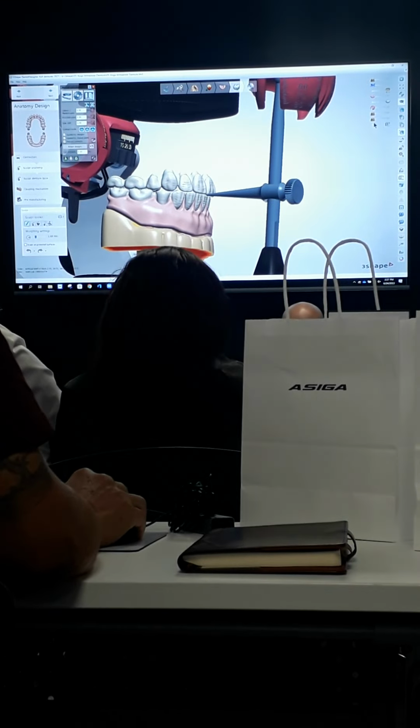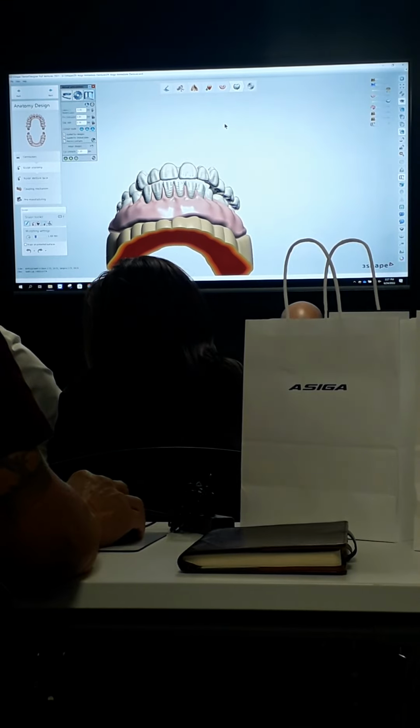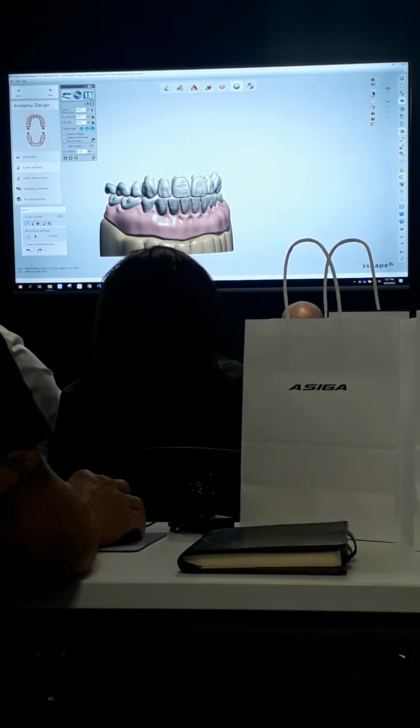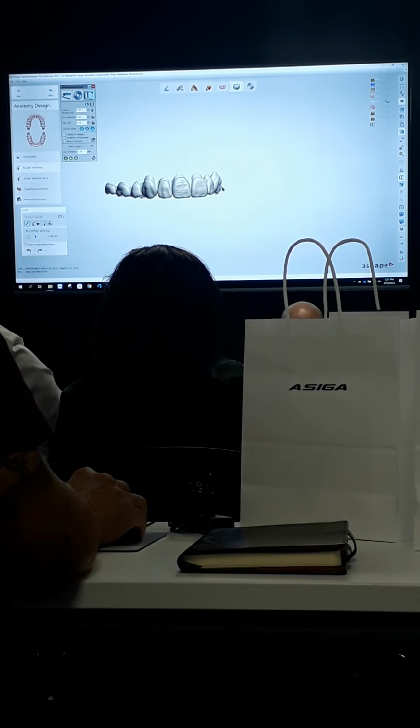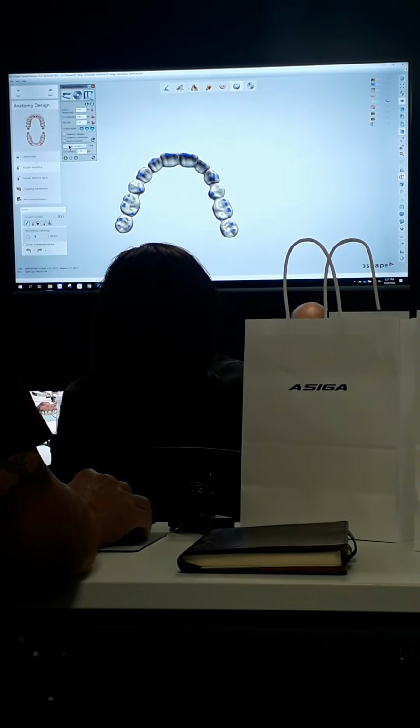Now I'm going to turn off my articulator so I can see a little bit better, and I'm going to run it. So there's my function. Let's say I want to equilibrate this a little bit. Here I can see I've got access to this Adapt Designs button. You have to put a value in the cut contact.